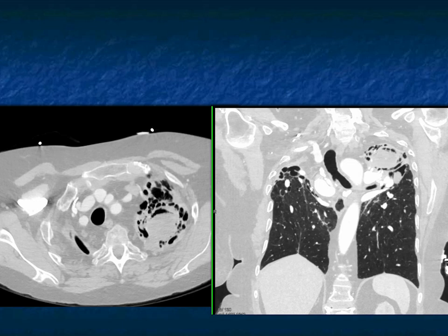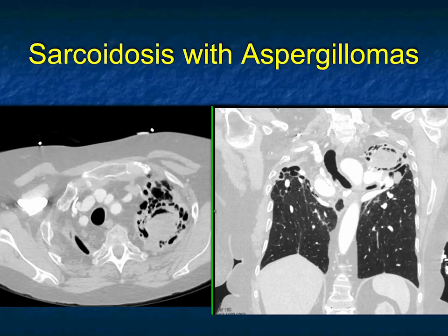When you have a cavitary lesion, patients are often immunosuppressed. But this retraction and then the cavitary lesion with soft tissue mass, you got to go through a differential diagnosis, and that's going to bring you to sarcoidosis. Sarcoidosis can be presented in many ways. This is one of them. Not capsular retraction, but lung retraction, hilar retraction, and often patients will get secondary infections with aspergillosis. A very, very classic case.